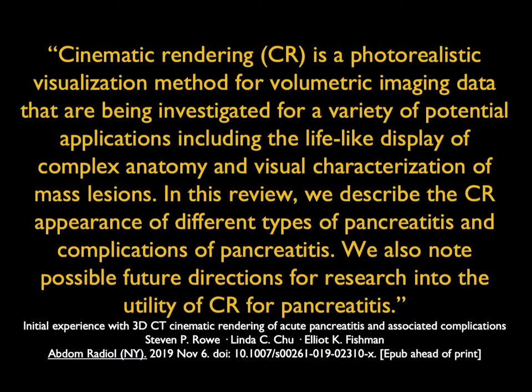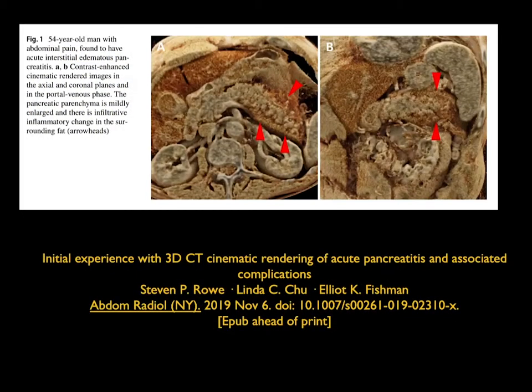Now, we've used cinematic rendering not only for tumors of the pancreas, and there's a lot of work published on Felix, and we use some cinematic in that as well, but also a recent article on pancreatitis by Steve Rowe. Here showing you nicely the edema around the gland in the body and tail, consistent with acute pancreatitis.